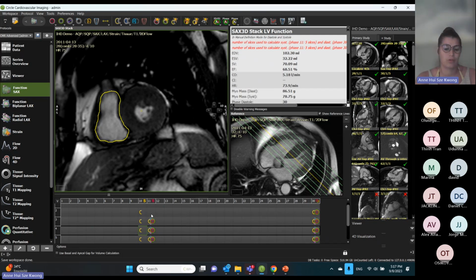If, for example, the contours are not good enough, you can fix them. You can click on it and just use a simple mouse to fix the contour, like that, for example. If I push the right mouse click on it, I will smooth. Otherwise, you have a box of tools.